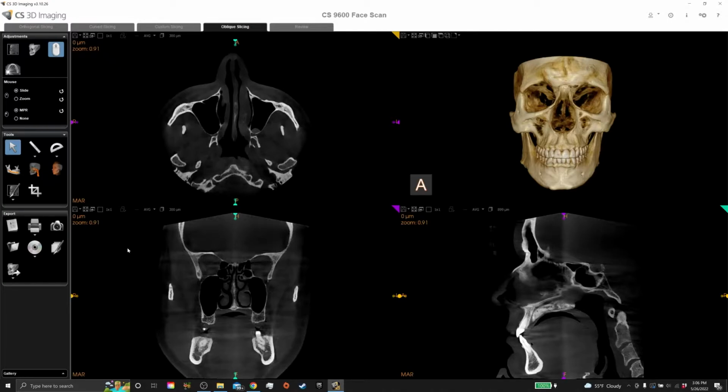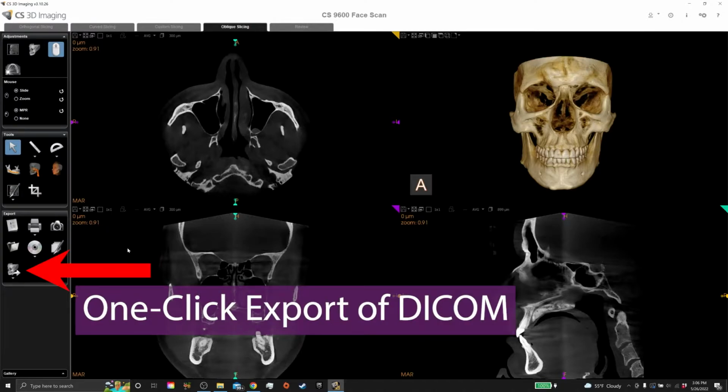There are some moduled add-ons that may be of interest to you, and we will cover a couple in this video. Carestream Dental CBCTs acquire natively in DICOM format. Users enjoy a very simple process to export volumes for use in third-party software. You will be challenged to find another manufacturer that makes it easier than Carestream Dental does.